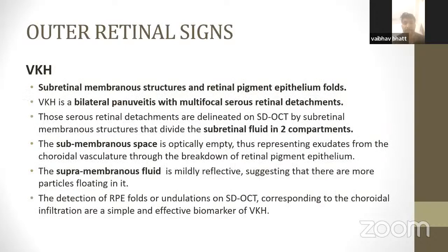Now, the outer retinal signs. In VKH, subretinal membranous structures and RPE folds can be seen. VKH is a bilateral panuveitis with multifocal serous retinal detachments. Those serous retinal detachments are delineated on SD-OCT by subretinal membranous structures that divide the subretinal fluid into two compartments.